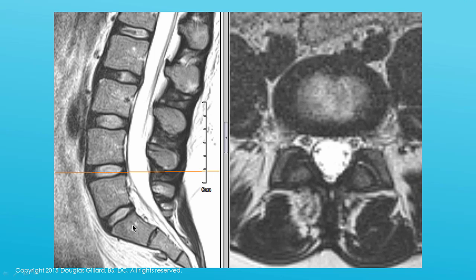So same deal though. Here's the sacrum. Okay, you can actually see the sacral segments. Remember, these start out as 5 segments when you're born. They fuse by the age of 20. They're completely fused into sacrum. There's L5, L4, L3, L2, L1. This is a young person, you can see, because the discs are nice and white.